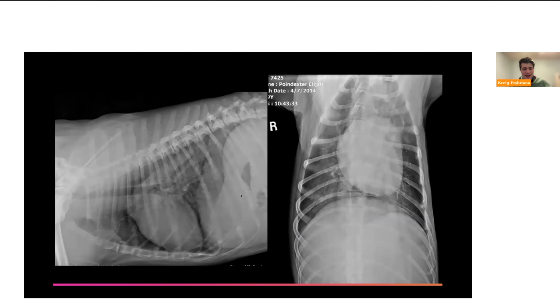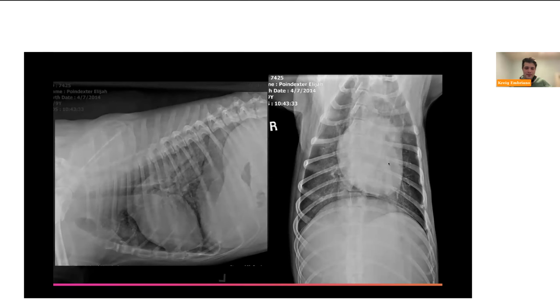And so this is a dog that has a pretty significant unstructured interstitial pattern. It's fairly diffuse. You can see some of it right here, but it's definitely more severe caudodorsally, right? Just increased haziness throughout. And you can see it orthogonally as well. We're having that persistence of pathology here.